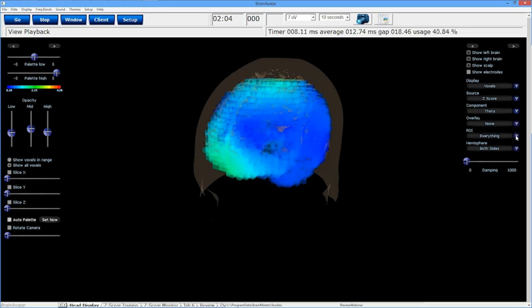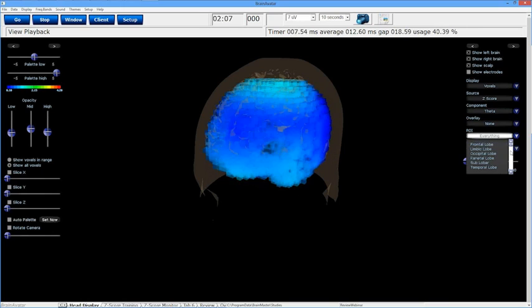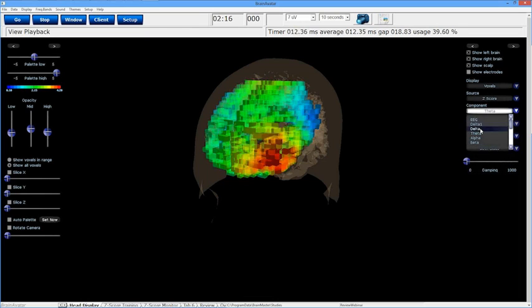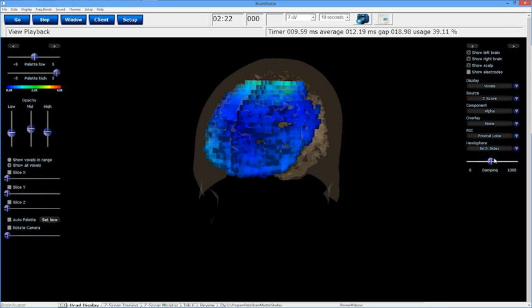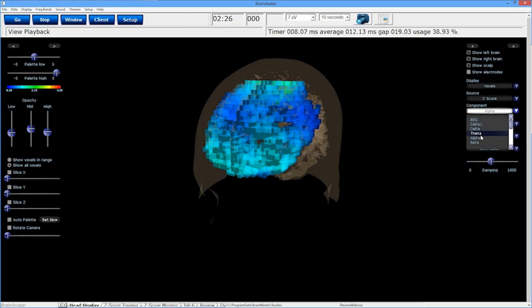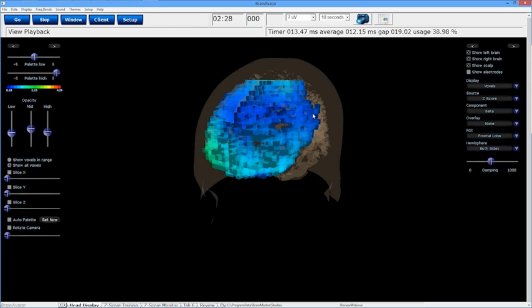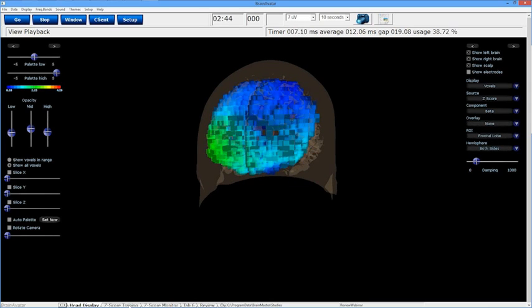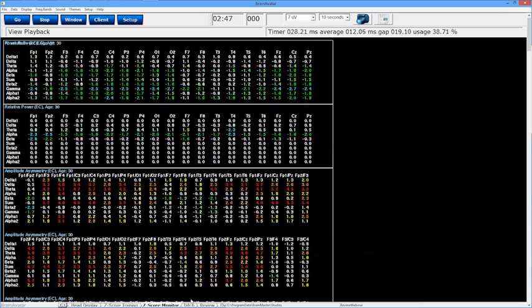And then, of course, from here, I would actually be able to use my ROI section to break it down a little bit further, look at different sections, different bits of information. I can dampen it if I choose to slow it down to understand a little bit better maybe what was going on. But basically, by looping it over and over, I'm able to see in general kind of what those numbers were at. And it allows me to look a little bit further in depth at what possibly might have been going on.